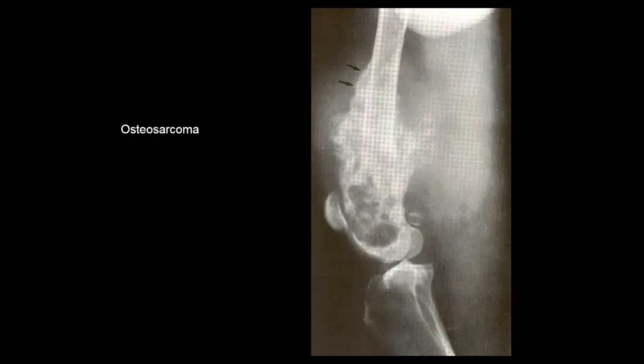Osteosarcoma, this is bad. This is a distal femur. Here's a tibia, here's a femur, there's a patella, there's this triangle. See the osteal reaction here, severe periosteal reaction, loss of bone, trabecular pattern here in this dog. This is an amputation case and probably euthanasia.